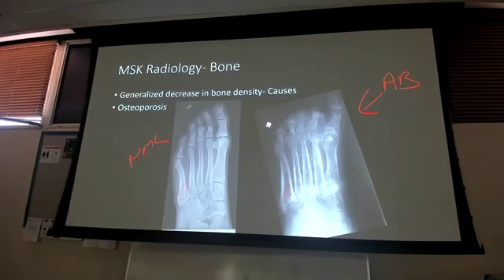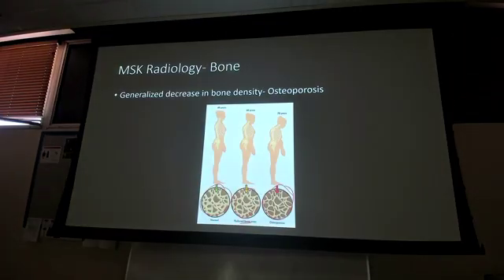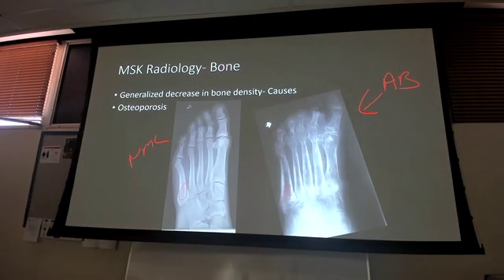It's not quite that, right? Because there is bone there, but there's not as much because that trabecular pattern is degrading, making more space in between the bone, right? So therefore it's becoming darker or more radiolucent than it did if we were healthy. That's kind of what's going on there.